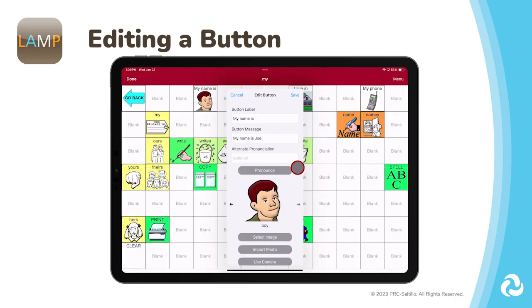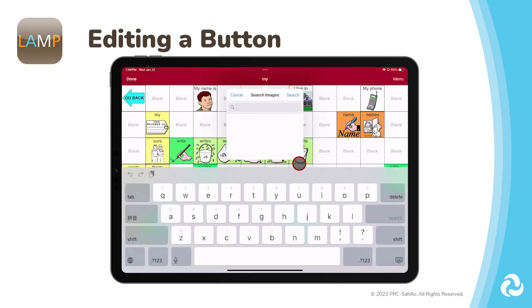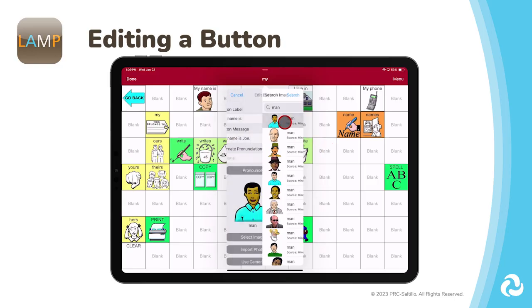You can adjust the pronunciation of the words on the button under Alternate Pronunciation. You can use the suggested image that is predicted by the button label, or tapping on Select Image allows you to choose a symbol from the symbol library. You can search the symbol library by tapping on the magnifying glass in the upper right corner of the Edit menu. Scroll through the list and choose the symbol you like.